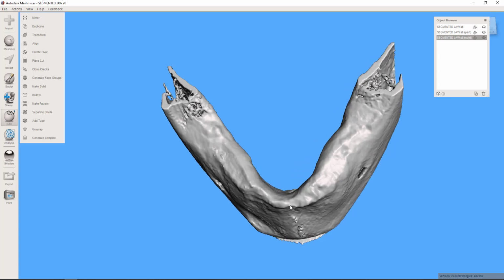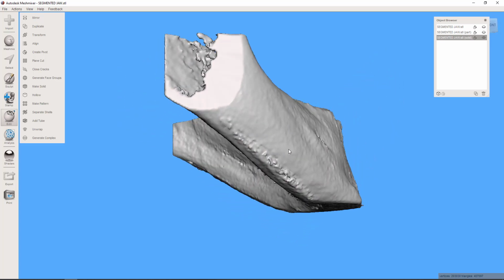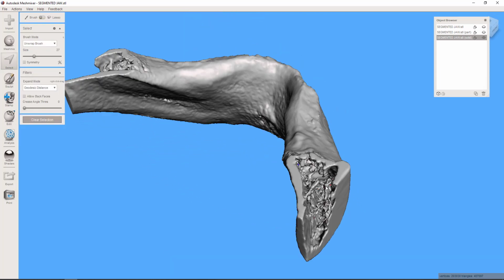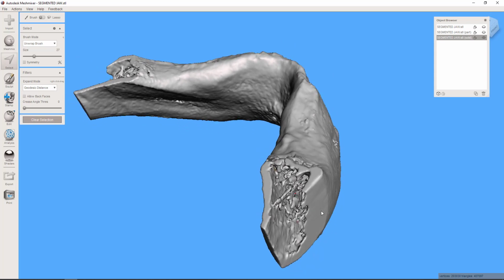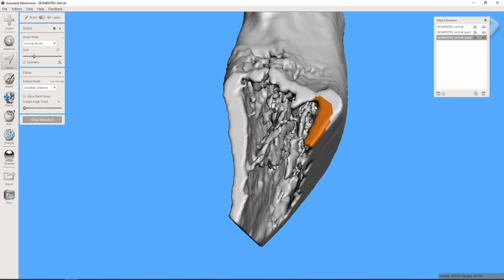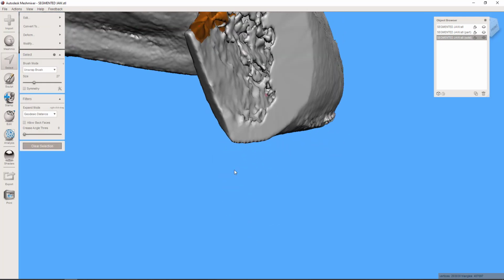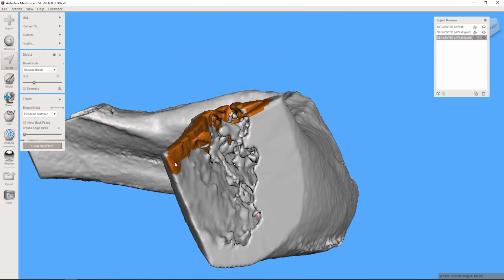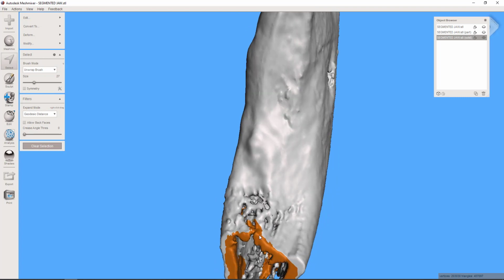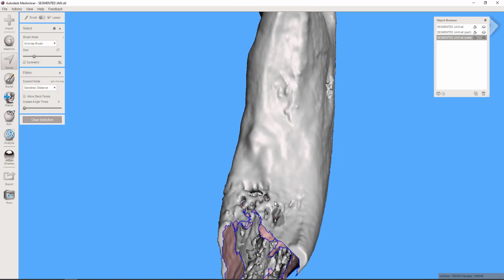But I like to make these a completely solid, watertight jaw. So stuff like this is obviously going to be problematic for that, right? There's a few ways we can deal with it. We can go ahead and separate out that little inside portion from the outside portion. And I'm doing that by just going around the boundary of any of those porous areas, and then I'm just going to delete that. Okay.